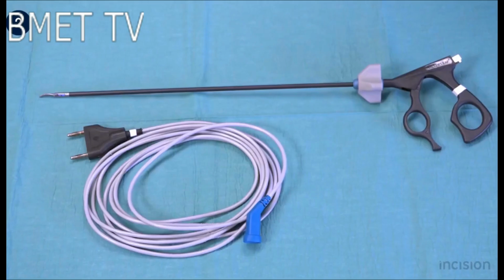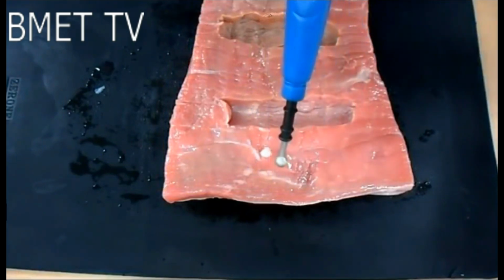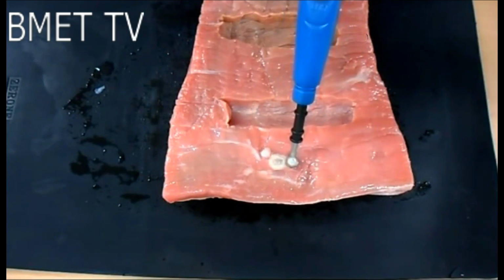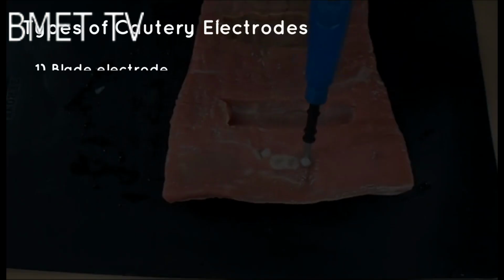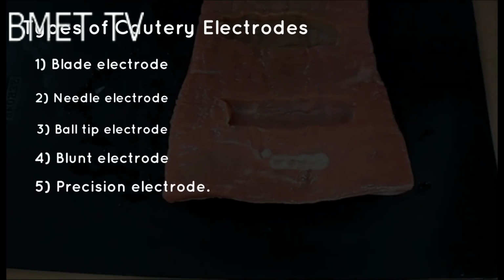Cautery electrodes are available in different shapes and sizes depending on the surgeon's requirement. Electrosurgical pencils can be operated either by hand or foot and are reusable and also come in disposable variants. ESU pencils give surgeons the ability to control cutting and coagulation settings by buttons or switches. The types of electrodes are blade electrode, needle electrode, ball tip electrode, blunt electrode, and precision electrode.